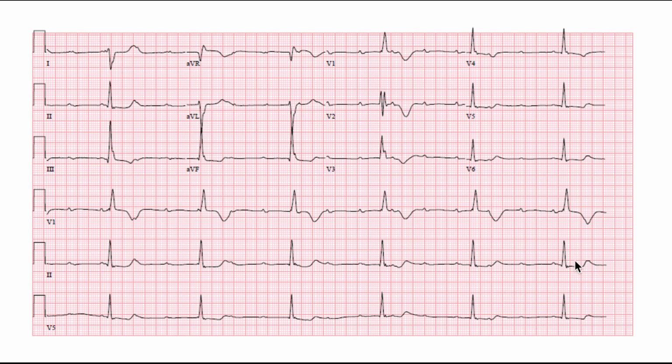So the question that you can answer here is not just the diagnosis, which is third degree AV block, but you can also determine, hey, the atria and the ventricles are not communicating. The atria may be firing and eliciting these P waves, but it's never getting down to the ventricles, so the communication is off. And that's really what we're trying to figure out.